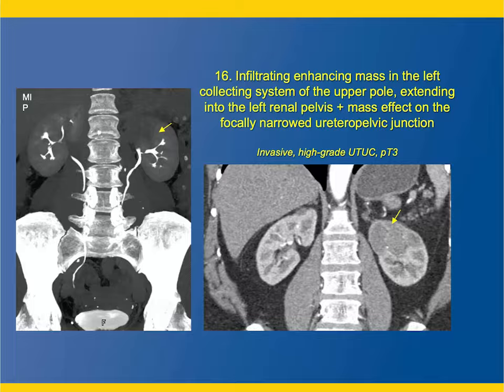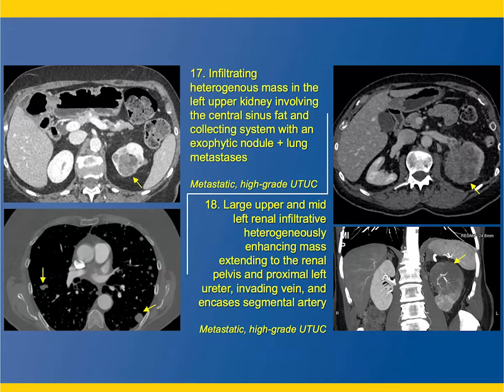This is a really nice case. When you look at the left kidney, you notice that you're missing the calyces to the upper pole. When you look at the coronal, you can see the infiltration. So infiltrating mass, again, you could say, well, could this be lymphoma? But lymphoma usually displaces and doesn't amputate the calyces. When you give me calyceal amputation and infiltration, then I'm going with a transitional cell carcinoma, and that was the answer in this case. And just a couple more examples.